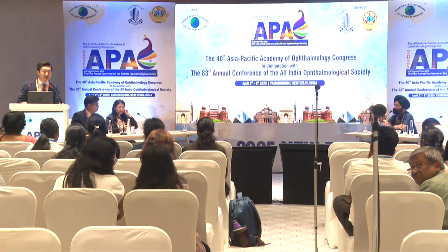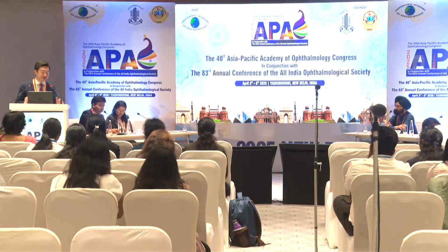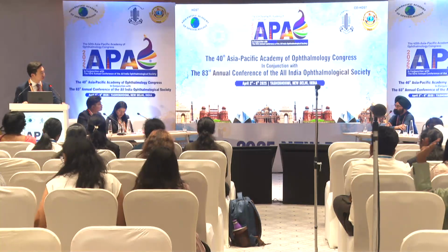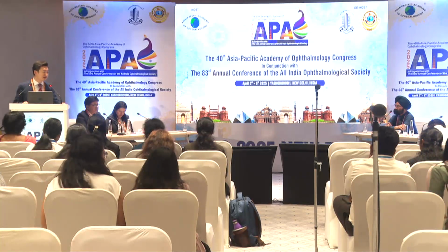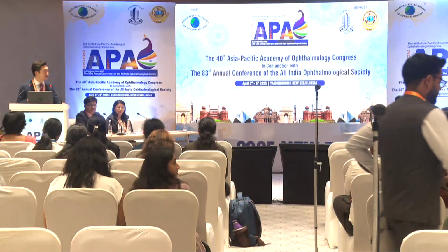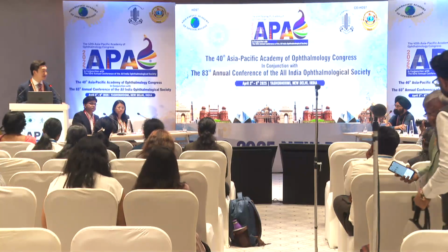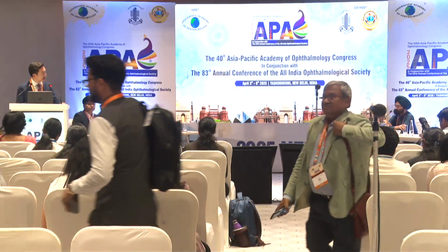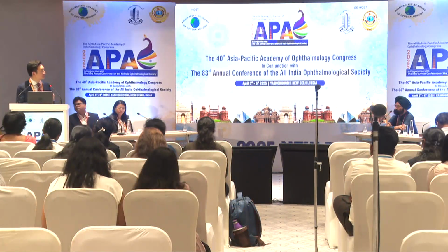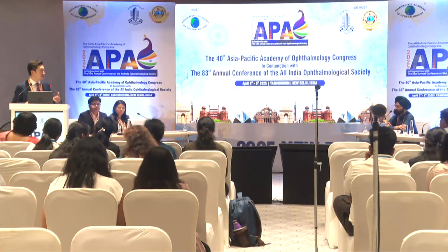Yeah, that's a great question. So I mentioned AOD 500 in this context because in the study that I described, that was the most predictive of progression from PACS to PAC. We find, though, that depending on the outcome measure, whether you're looking at progression or IOP, sometimes the exact parameter describing angle width can vary. So sometimes it can be the area in the angle, sometimes it can be angle opening distance. So this is something that we're still working on in the field to figure out which one parameter we should be using. But AOD is certainly very easy to measure and understand.